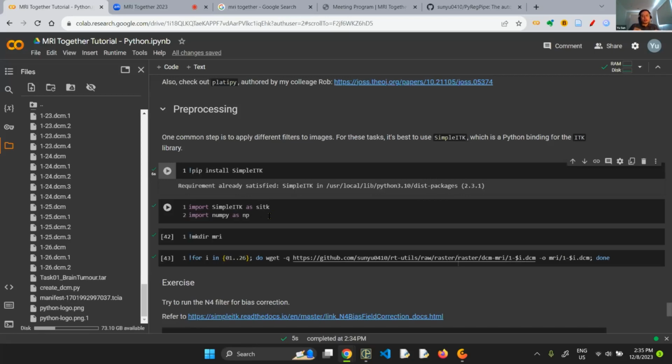It's like an image array, but it's space aware, location aware. For example, if you have a patch, the SimpleITK object knows where the patch is lying in 3D space. So it's different from, say, a NumPy array, where a patch is just a patch without any information about location.